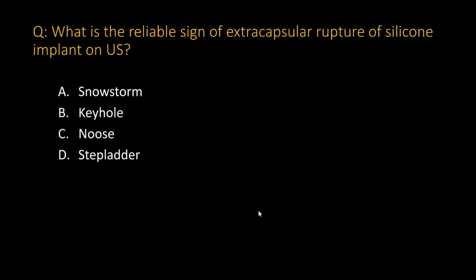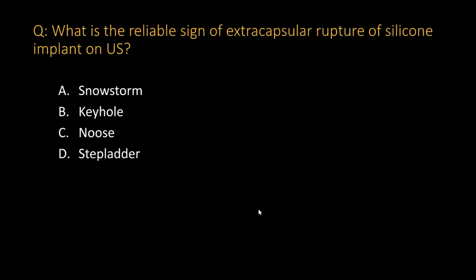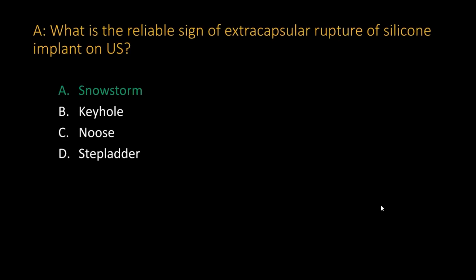What's the reliable sign of extracapsular rupture of the silicone implant on ultrasound? Now we are asking a question on silicone implant. All right, so all of you get it right. This is great. It's a snowstorm.